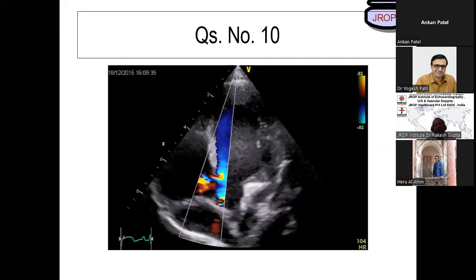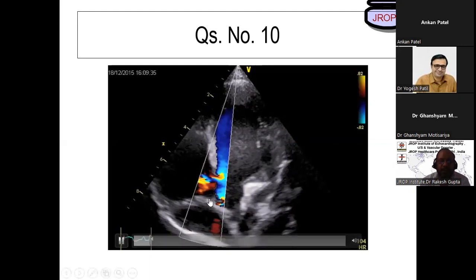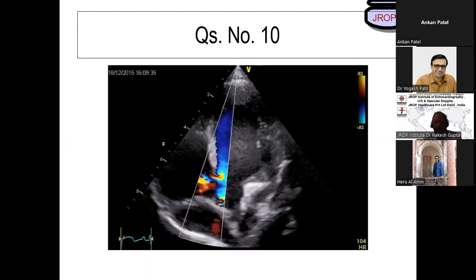We taught you about VSDs, type of VSD, which kind of VSD it is. You got 3 out of 4 already. Most likely this is a perimembranous VSD with outlet extension. I don't say it's perimembranous unless I see the parasternal long axis window. The aortic valve is right over here. So this is outlet, possibly muscular VSD. Outlet, why? Because aorta is open. So whenever you talk, you should talk of outlet, inlet, perimembranous, then doubly committed or muscular.